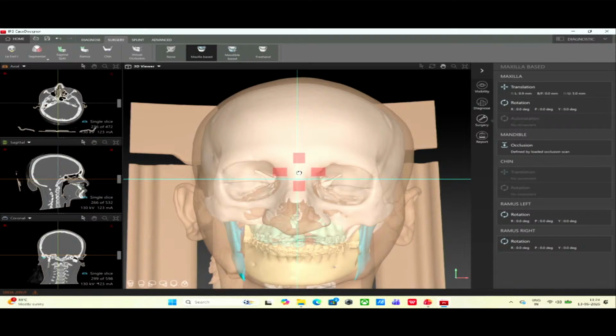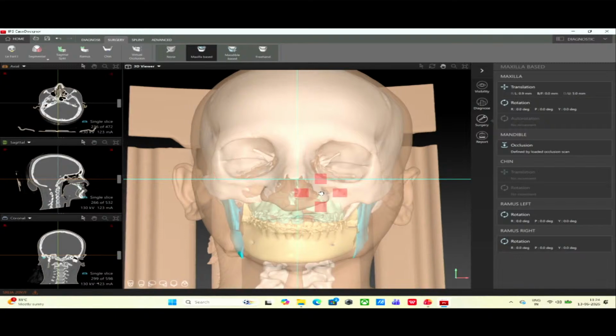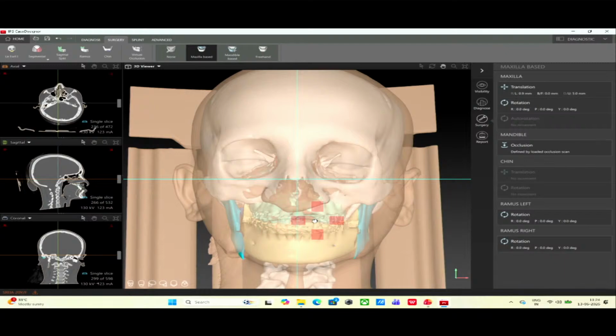And then what I do is I set this vertical line through the Nasion point. And if you want to, which is easier, also set the horizontal line to the infraorbital rim. And you can see here I didn't set my head position right. The left orbital rim is a little bit slanting downwards compared to the right side. It can also be anatomical variations, but that's why I'm saying, if you set the natural head position, set it right.